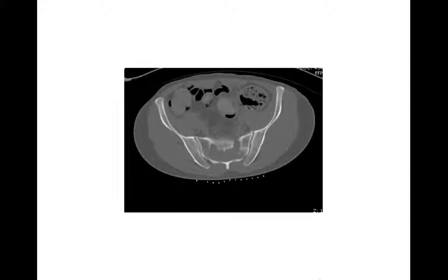All right, so we're going to move on to the sacrum now, and a brief differential diagnosis of common lytic lesions in the sacrum. Here we have this geographic lytic lesion taking up most of the mid portion of the sacrum. This one turned out to be a metastatic lesion from a medulloblastoma of the brain. In this case, but metastatic lesions in general are going to be one of the lesions you're going to think about which occur in the sacrum.